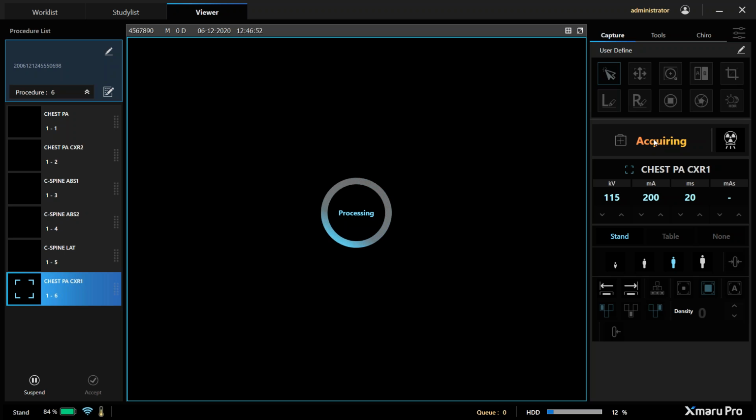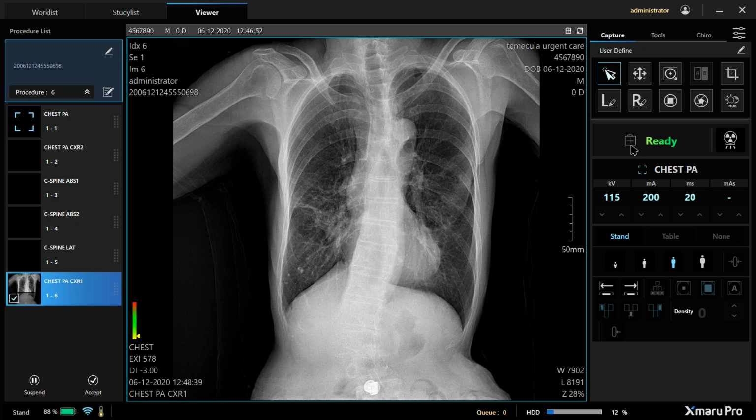So now you know what the system is doing at the time of exposure, showing you it's ready. You'll also notice along the bottom, it will show you the battery strength, temperature, and signal strength are right there. So even before you start an exam, you can decide if you need to change your battery because it's time to change it.